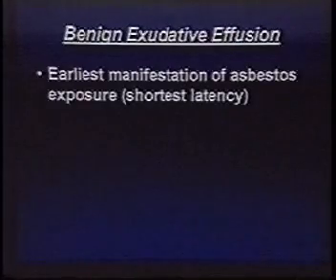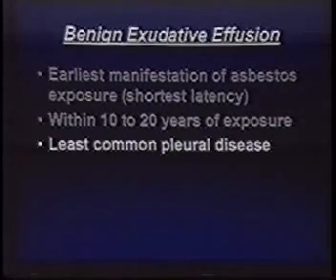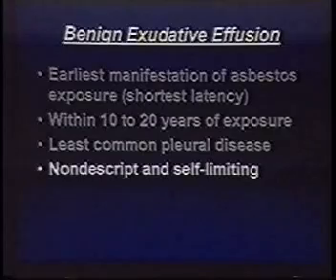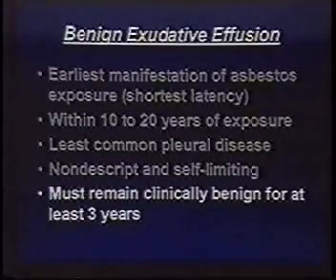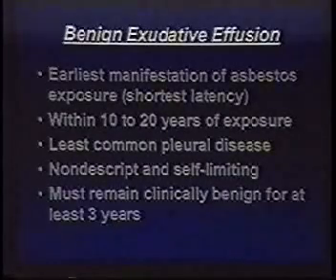Benign exudative effusions are the earliest manifestation of asbestos exposure, which can be seen within 10 to 20 years of the initial exposure. It is the least common manifestation, is usually nondescript and self-limiting, and must remain clinically benign for at least 3 years to establish a diagnosis.